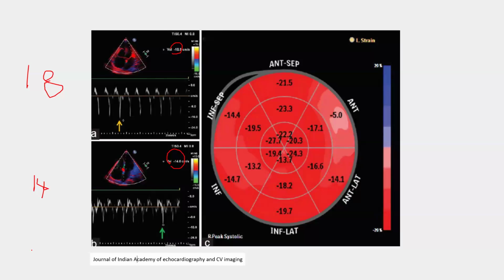Improving. Look, he didn't have a pericardiectomy. But I'm telling you here that doesn't go with constriction, because in constriction we said the medial is faster than the lateral. But look, when they did the strain, what did they find? They found that the lateral part has a lower strain. So the strain is much more sensitive, and it picks up patients with constriction earlier than the conventional hemodynamics will do.